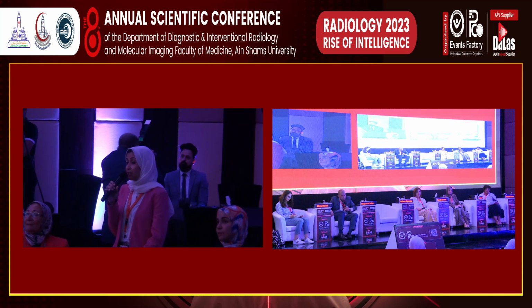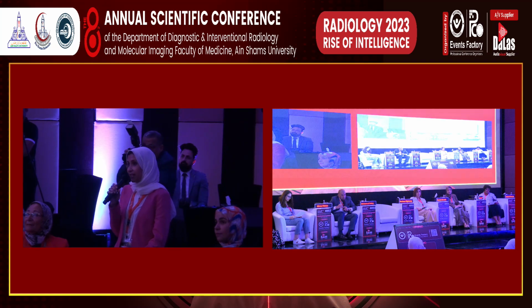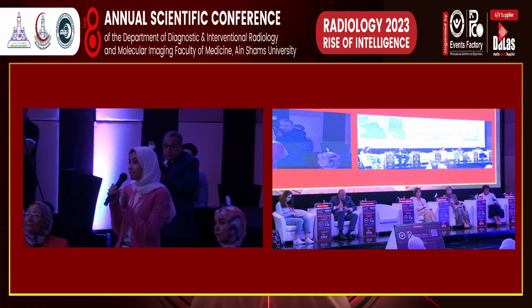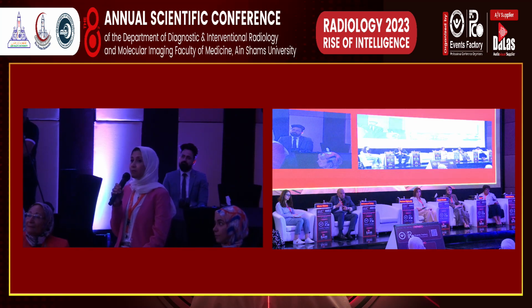طيب عاده الابتيك اللي هو بيبقى انفلاماتوري او في العيانين الدايابيتك بيبقى ديفيوز وهوموجينس، وبلاقي الابتيك مينلي في الوال بتاع الانتستين، ولما ابص على الوال نفسها في السي تي هلاقيها فيري ثين ومفيش فيها اي ماسز او ثيكنينج او حاجه سسبيشس. طيب كل دوت جميل.